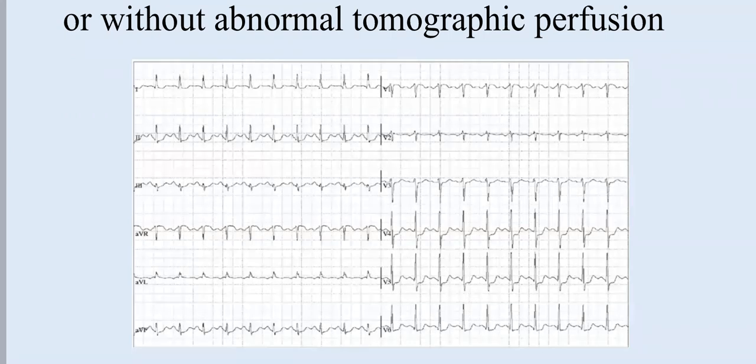We have to wait and see the effect over the recovery time. If they are still developing changes with the symptoms, then we have to comment on that. But the changes that I see in front of me are J point changes, not very significant.